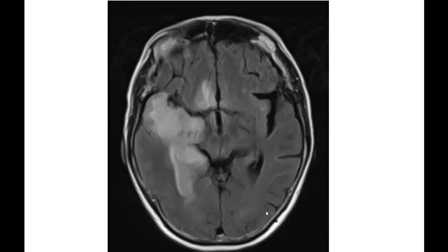So you can see the inflammation in the area called the hippocampus here. You can see part of the temporal lobe involved. You can see part of the insula involved. You can also see some frontal lobe involvement. So the abnormalities on the MRI typically are on one side but can affect both sides of the brain.